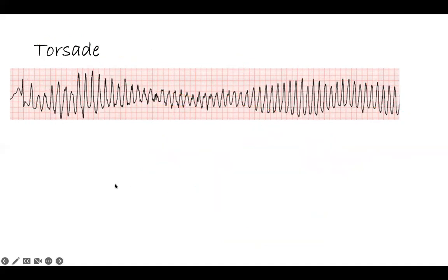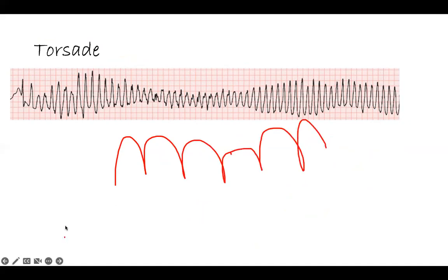You see, it's not like regular ventricular tachycardia. So this is regular ventricular tachycardia. This guy, they go like that, then they come like that, and they go up, up, and they come like that. So unlike VFib is doing this. This one, they go like big ventricular, wide complex. Okay.